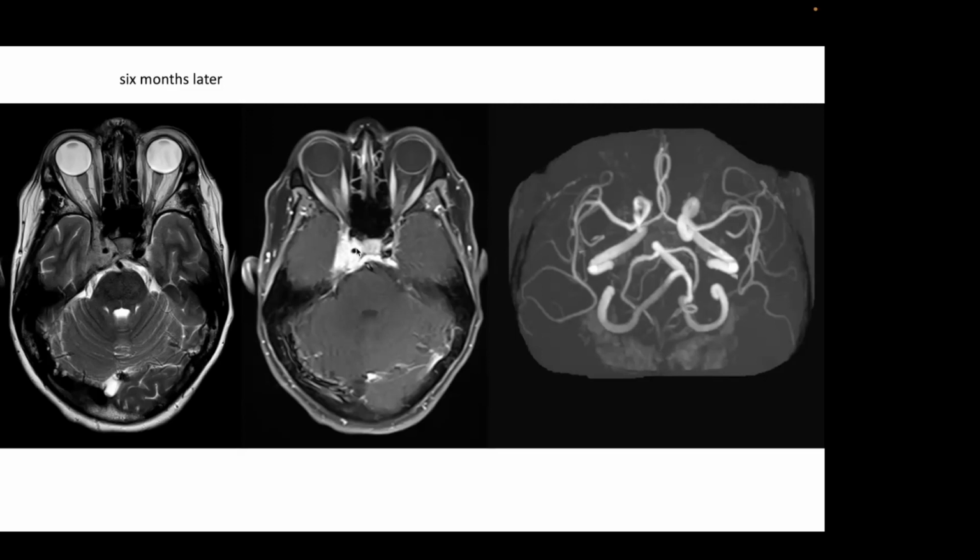The encasement of the carotid, the small carotid artery, favors the diagnosis of meningioma, which is what this is, has been followed. This is what this represents. So again, just a nice case showing you this phenomenon in terms of CT and MR, that we're often challenged on MR to reach the correct interpretation of the findings, whereas on CT, the challenge is usually just finding the abnormalities. So CT, in my opinion, is much harder to read than MR in terms of actual detection of the abnormality.